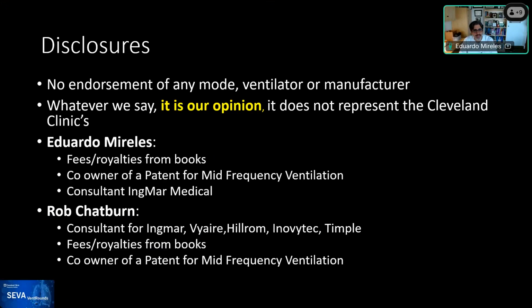But it's adaptive, and I think that there's a little bit of a clue that this is adaptive. When I was looking at this, you can see the different heights on the pressure, and obviously this is a slanted image. But I could see on the video that there was a little bit of a difference, and the goal is that they're trying to get to this tidal volume of 540. All right, so that's adaptive. So the ventilator is going to move up and down to achieve that tidal volume. All righty. Good question.